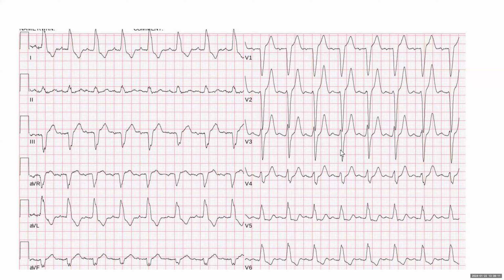Okay, so what did you guys write? Let me see. Sorry, I missed. So first degree, right bundle with sinus tachy, first degree, left bundle, sinus tachy, ST, long QT, first degree. Okay, like that, 1, 2, 3, 4. No one mentioned 5 codes.